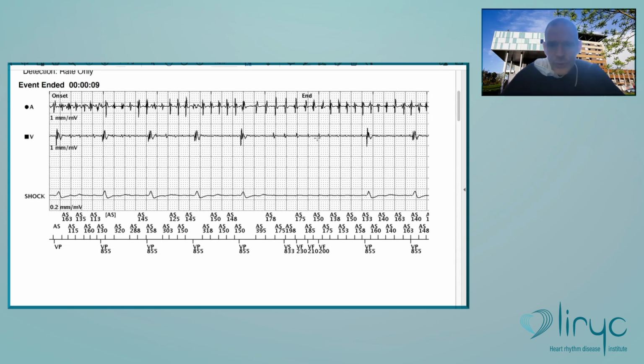If you're not dependent, at one time you will see one real ventricular signal that will reset the level of sensitivity, and therefore you will not sense the one after. That's why when you are dependent, it's a problem: first, you increase considerably the risk of oversensing; second, the probability of prolonged oversensing; and third, of course, the risk of asystole because of oversensing.